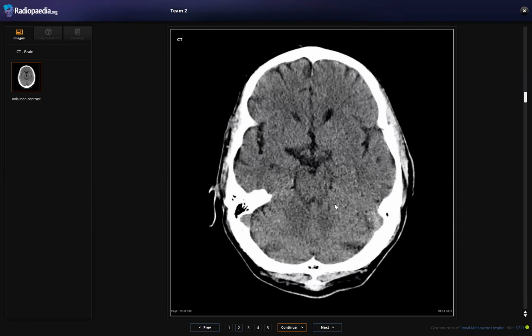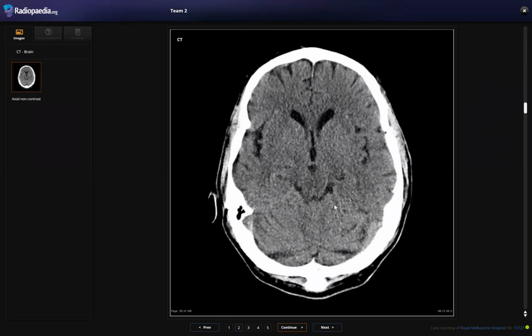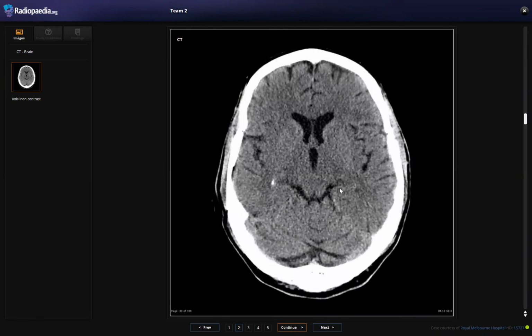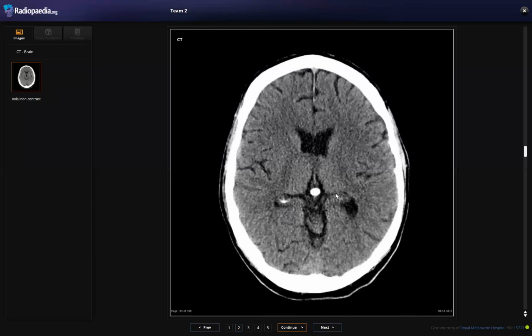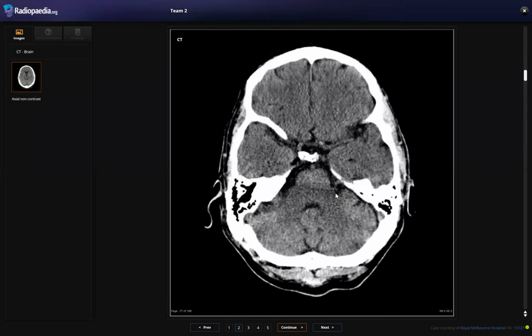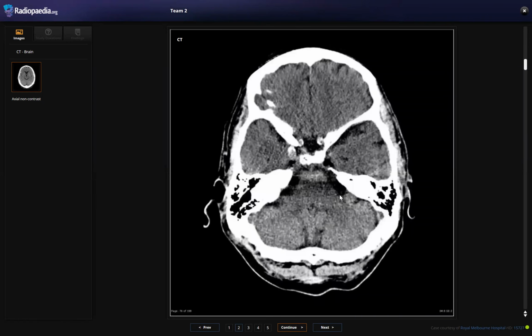So in my initial view, I don't see any evidence of intracranial bleed. There is no midline shift or ventriculomegaly, and if the patient has a presentation which is acute, I need to rule out any acute pathology or infarct, which is sometimes not identified on initial CT. So I would like to proceed with an MRI if possible.